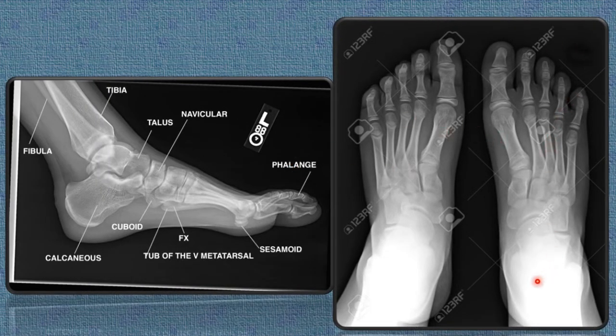Foot. These are the tarsal bones, right? And these are the metatarsals, 5, and these are the phalanges, right? Also phalanges. So you can see again, this patient is also growing, right? Epiphysis and physis. So this is also an X-ray of a growing person. This is the sesamoid bone under the first metatarsal bone, right?